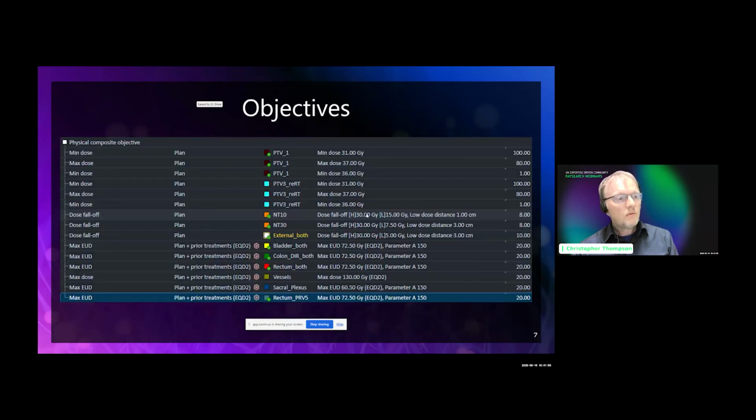So we can go ahead and set some objectives. We've made that plan, the background dose, as has been described. We've added our clinical goals. We're not sure whether to use a rectum PRV or not, so maybe we'll do a plan with both, so we can show our clinician colleagues so they can make a decision based on risk due to organ filling. They may be slightly cautious.